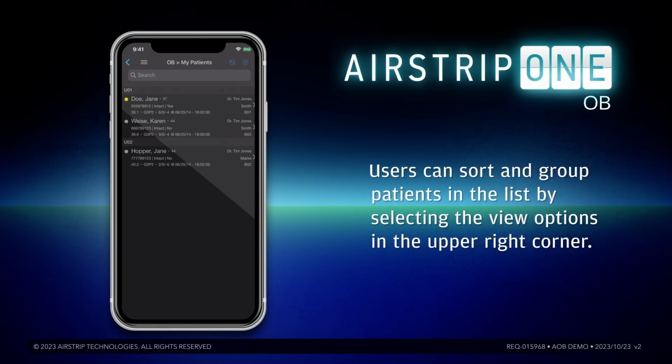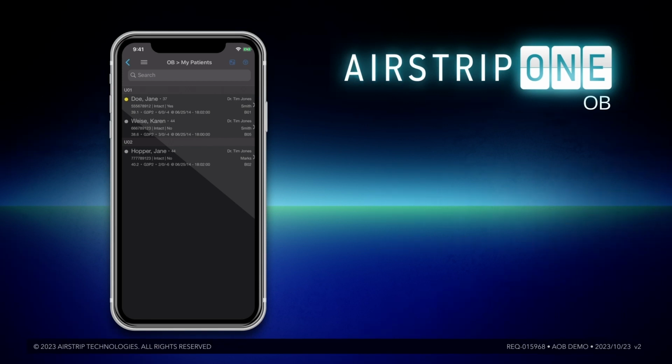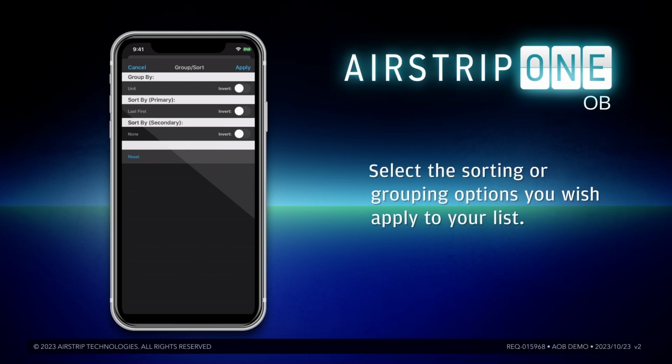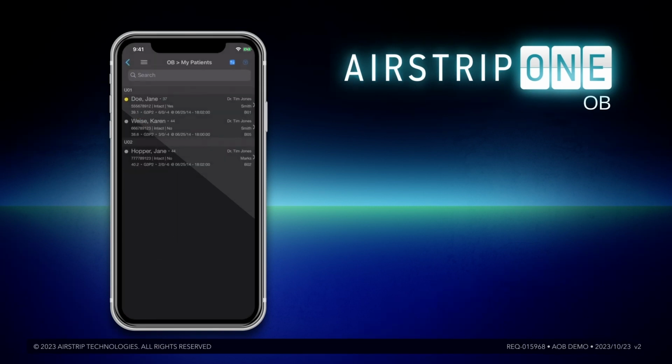If users would like to sort their census differently, they may select the up and down arrows icon in the upper right corner of the screen. This will present the user with different criteria to group and sort by. Once the change is made, select Apply and the census list is updated with the new criteria.